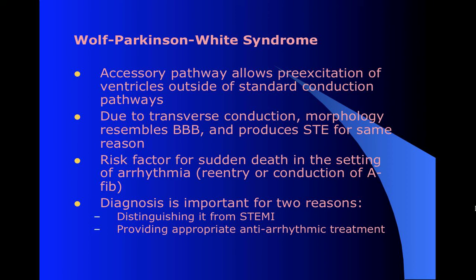All right, WPW. This is, of course, caused by an accessory pathway of conduction. It allows excitation from the atria to the ventricles other than through the AV node, as it ordinarily will be. It's bypassing that. There's no delay as we would normally expect from the AV node. Because we're getting conduction from usually the side, it can look like a bundle branch block with that widening, and for the same reason you can see some elevation.